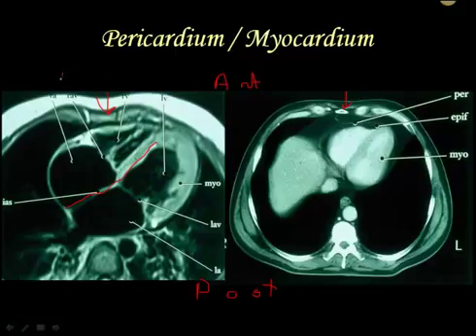So what they actually call this is called a long axis view. This is a very, very common plane that is used, obviously, as you can see here, in MRI, but it is also used if you're looking at things, for example, in ultrasound, and to a lesser degree in nuclear medicine. Now here's the thing. This type of imaging is for the most part driven by cardiologists.